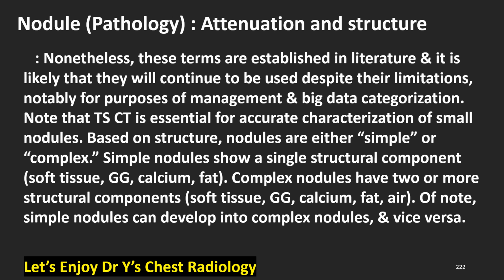Nodule pathology, attenuation and structure. Nonetheless, these terms are established in literature, and it is likely that they will continue to be used despite their limitations, notably for purposes of management and big data categorization. Note that thin section CT is essential for accurate characterization of small nodules.